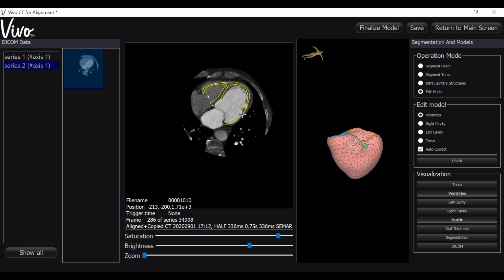So I'm going to left click on the outer outline, and you can see the red area beneath your crosshairs, and that is the area that you control. To increase this area, you would press Control and scroll wheel forward to highlight a larger area, scroll wheel backward to highlight a smaller area. And you can see that area that is in red here corresponds to a white area on your model. So these are directly related.